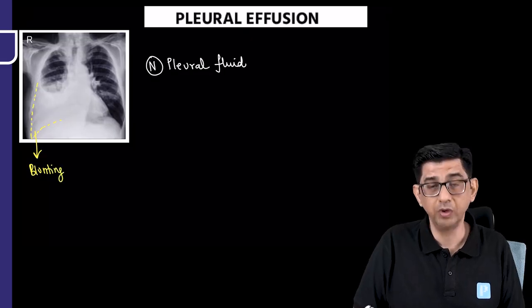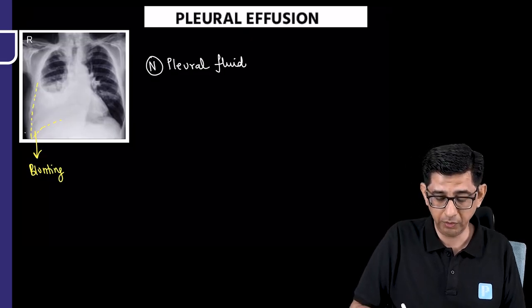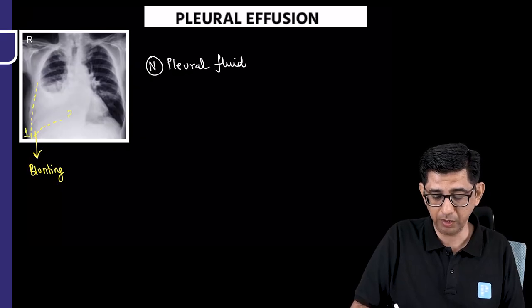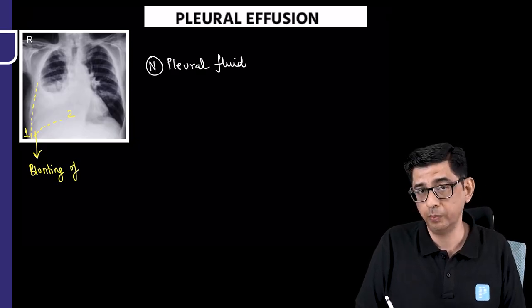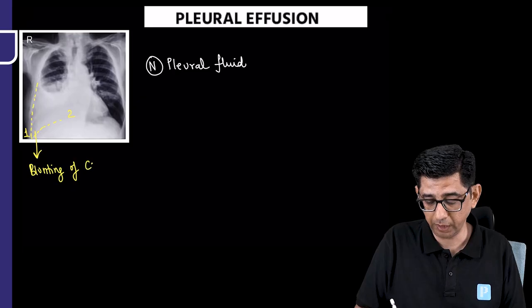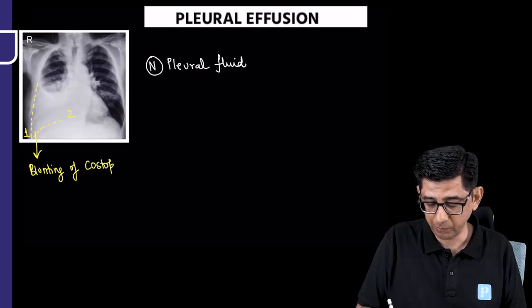You will notice that due to gravity, the fluid will first accumulate in this area, which I'm marking as area number 1, that is the costophrenic angle, and then subsequently the fluid will accumulate in area number 2, which is called the cardiophrenic angle. And in the exam, we just need to pick up those words.